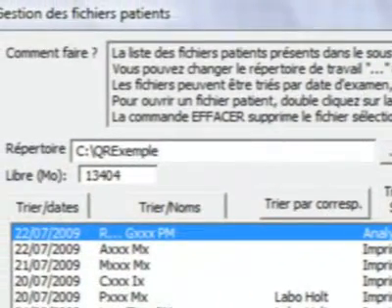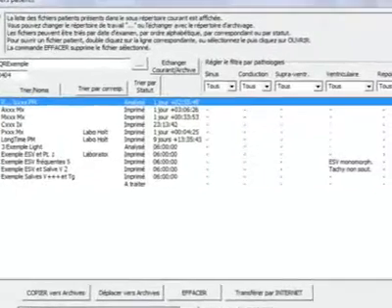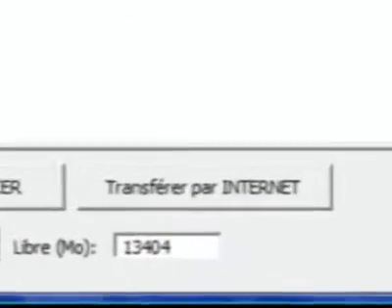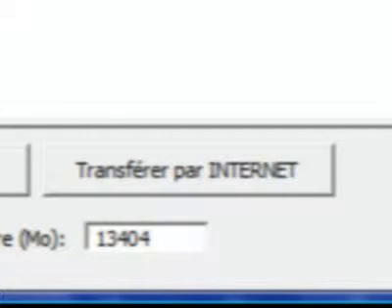It allows creating patient categories by year, by referee, by pathology. This list is associated with a database that allows you to research easily on patients with a particular disease. With this list, you can send a patient file via internet and generally manage patient files.